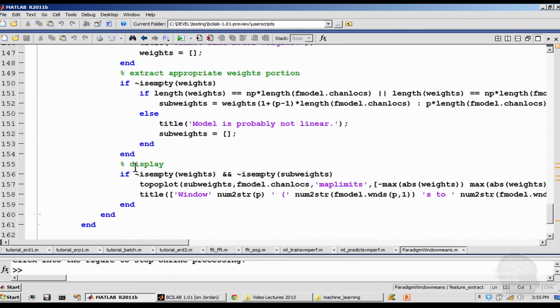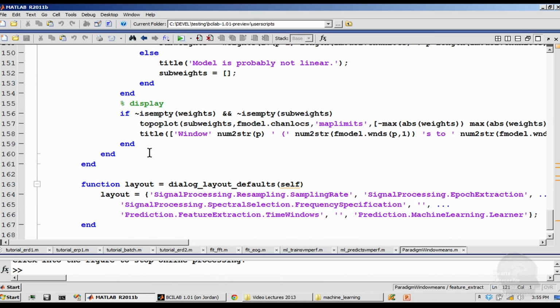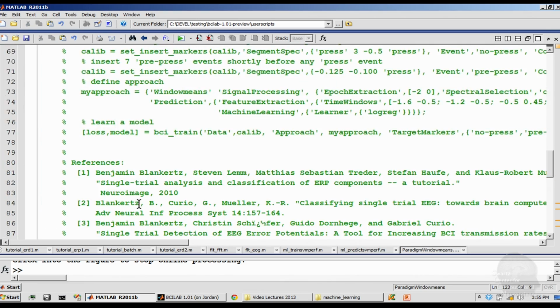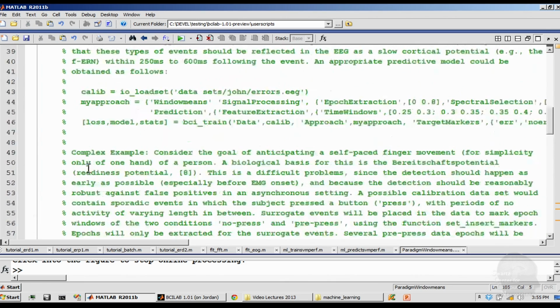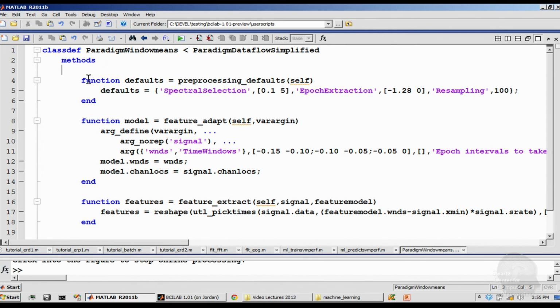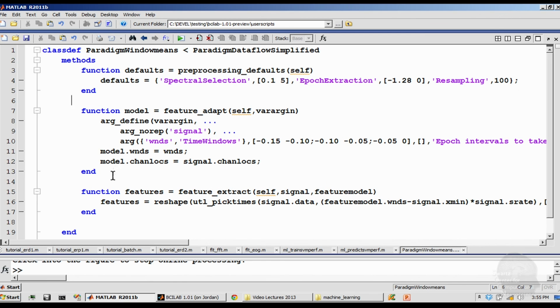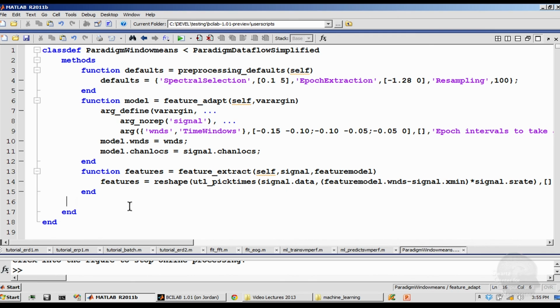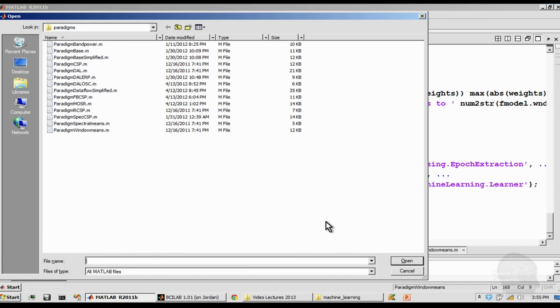This is what brought our plot up. It's optional. So if you're really being parsimonious, you can write a plugin without all this, without all the documentation. I just prove a point. So basically, this can be your BCI paradigm. And this will work in the GUI, basically. And obviously, you can go on and do much more advanced things here. It's also not really utilizing all the features. There's others which do much more stuff.